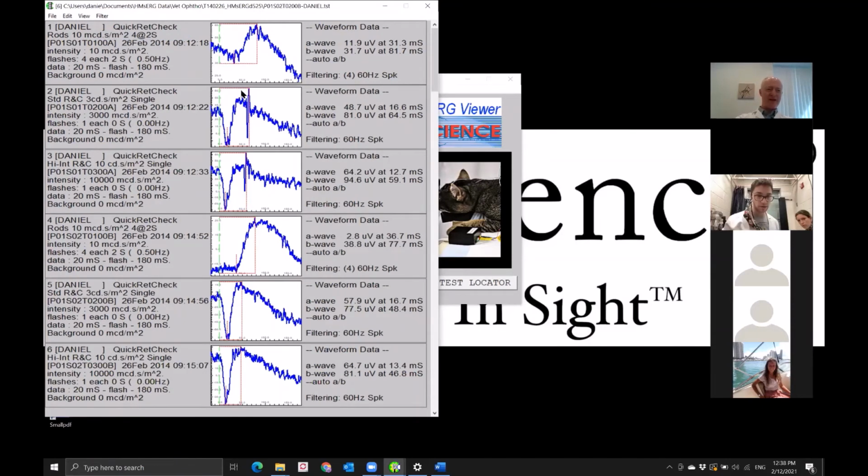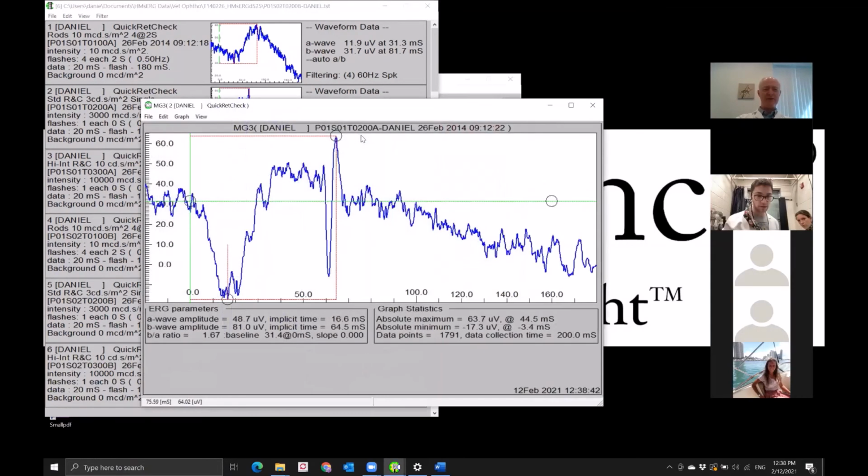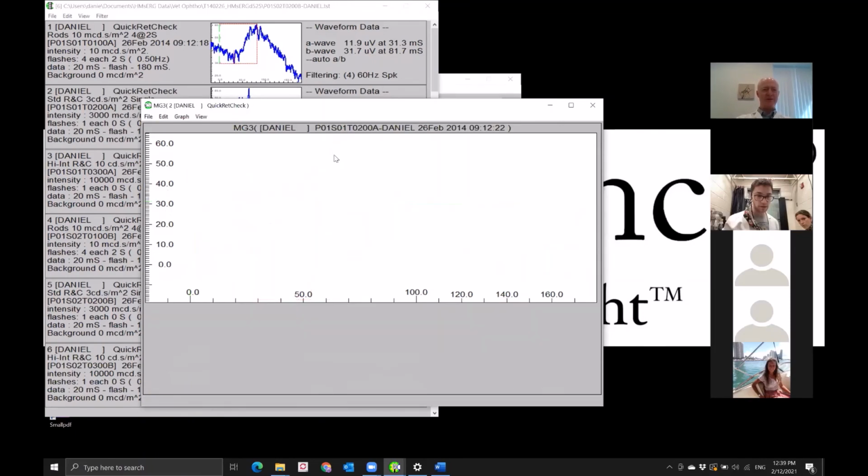Now I'm seeing here there's a little bit of an artifact, and it looks like in fact it may be picking up the artifact at the top. So let's go adjust those. So I go copy test data and go to the measurement graph. Yep, see, it's sitting here right on the top of this thing. So that's kind of throwing it off. And in this circumstance, since we're sitting on this artifact, I would recommend that we try to pick a point that is going to be fairly close to a peak other than the artifact.